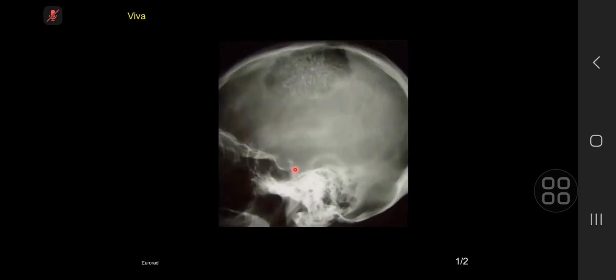It's a skull X-ray of a skeletally mature patient, which is demonstrating a lucent lesion with calcification or trabeculation within it in a very geographical pattern. There are also some focal phleboliths or densities within them, and I'm just wondering whether it's another example of hemangioma in the skull. Right.